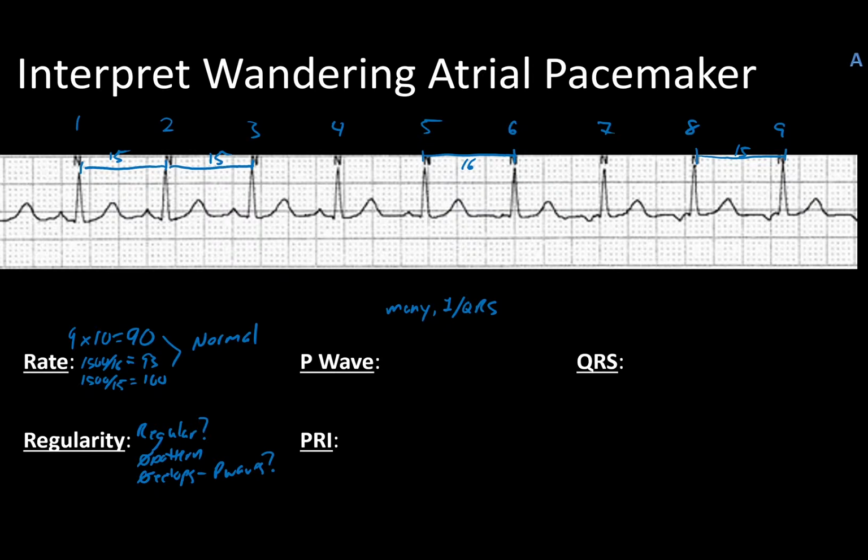So let's just start with the very first one, and I'm going to label that one A. And so all of the sharp ones that I see, I'm going to label with an A. And B is awful small, so I'm going to, or sorry, beat number 5 is a little small, so I'm going to give that a different letter. 6 is actually upside down, so I'm going to give that a C. And this one's even more pronounced. This one's flat, if anything, so I'm going to call that D. And this next one's inverted completely, so we call it D, and also inverted.